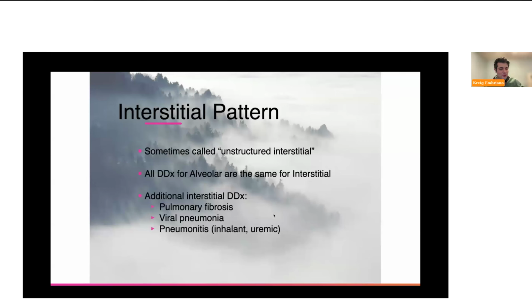A lot of people describe interstitial as a generalized fog. And so that's kind of what this background is here to represent. Some people use unstructured interstitial and interstitial interchangeably. Just keep that in mind. And that the differentials for alveolar are the same as interstitial.